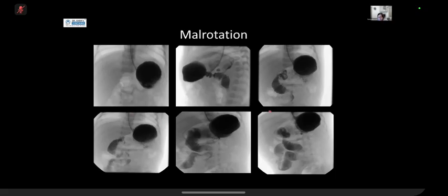This one probably is, but not really this one, just because, as I said earlier, the patient is quite rotated. You can't really see the costophrenic angles, and you can see that the ribs on this side are much shorter than on this side, showing that the baby is rotated anyway.